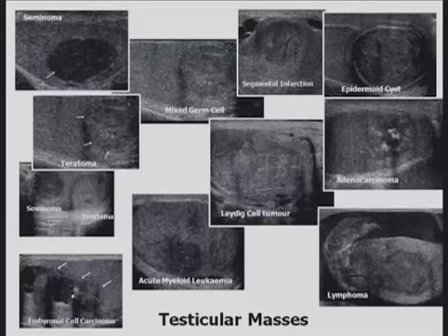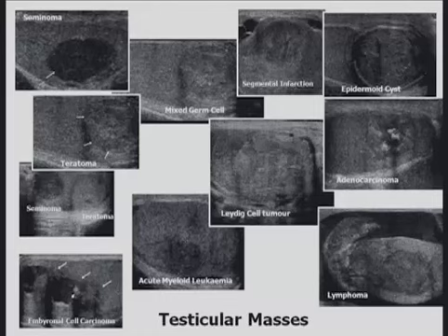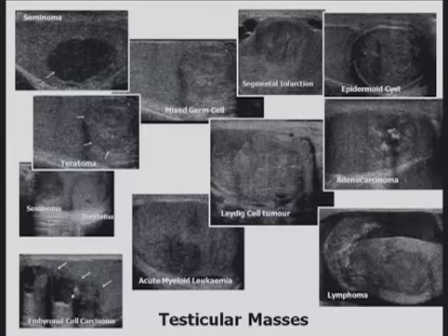If there is a segmental infarction or an epidermoid cyst, both of which are benign lesions and may mimic an intratesticular malignant abnormality, any pre-operative assessment that indicates that the lesion is benign will take importance to allow preservation of the testes.